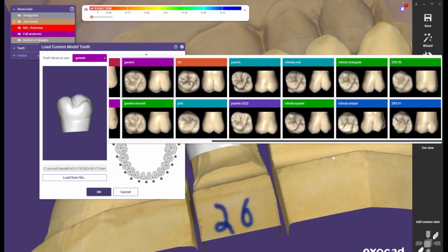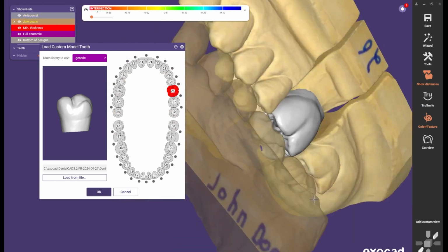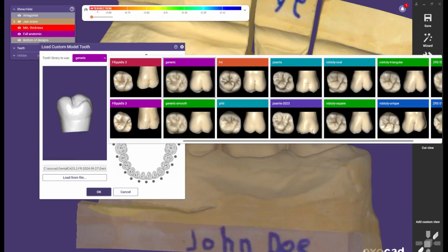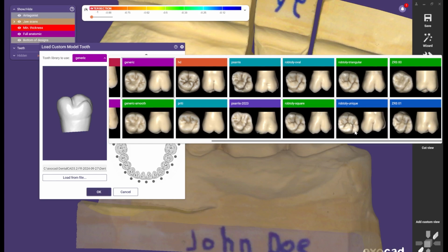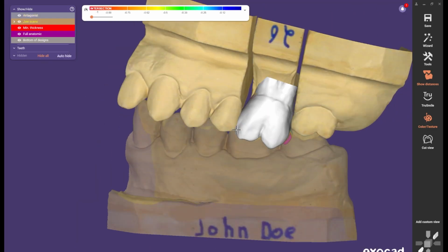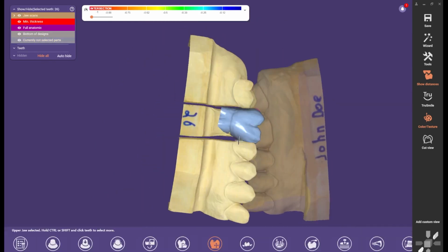Okay, usually you wanna just look at the teeth that you already have and choose something similar, so that you're gonna have a lot less freeforming to do. Let's see, I'll use this triangular shape. It has a little pointy cuspids, just like the teeth that I have.